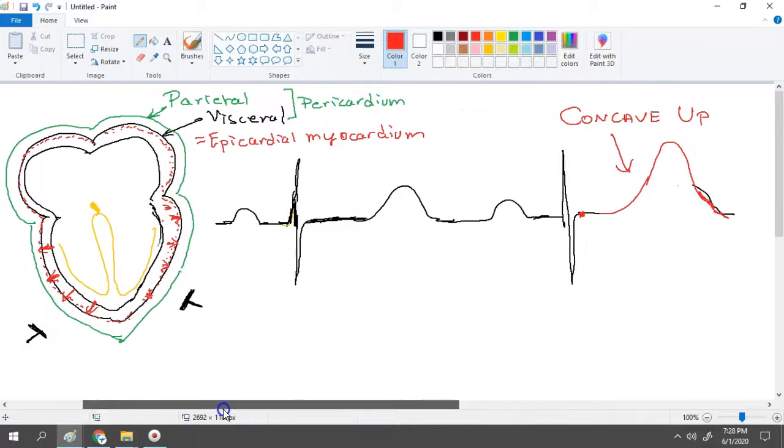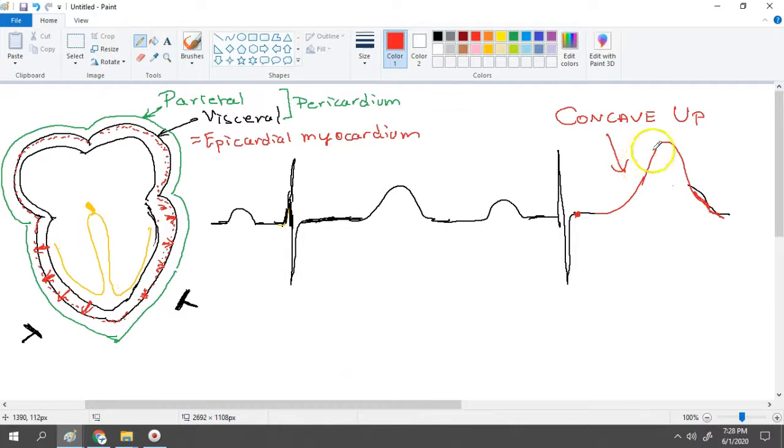I would bring you back to the pericarditis. In pericarditis, we will have ST segment elevation, which is diffuse and concave up. Diffuse ST elevation, which is concave up. So this pretty much explains the abnormality that you see in the ventricles. Now, in case of myocarditis and ST elevation MI, the ventricles having the maximum amount of myocardium usually show all the abnormalities in the ECG.